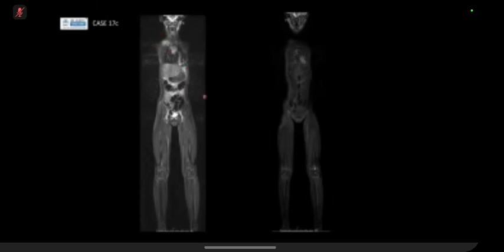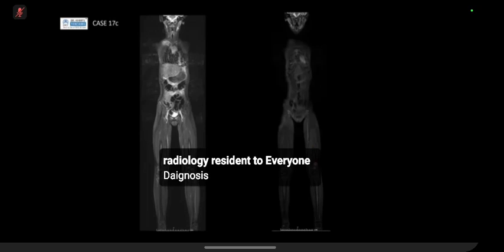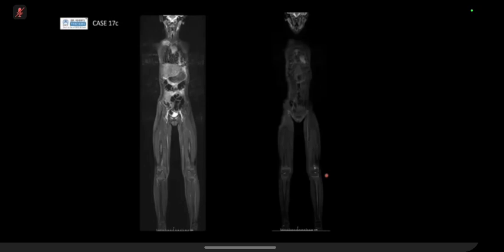Nowadays, with whole body MR, people use it to see if there are any other sites of asymptomatic disease, and often you're looking at the knees and ankles. You're looking for metaphyseal involvement, but often they can cross the physes and involve the epiphysis as well, as in this case. So this was discussed in the bone tumor unit, and given the MR findings, this was more likely to be CRMO.